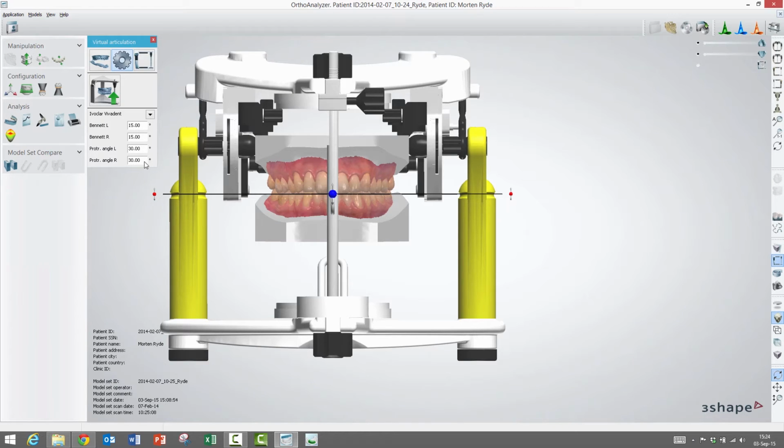These windows you see here, I think we have already explained a little bit what it is. In order to set the parameters, you have to left click inside the window and use the black arrows to set these parameters.